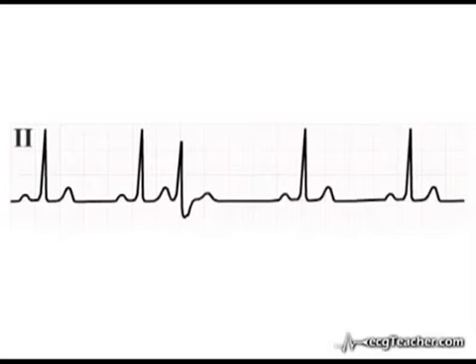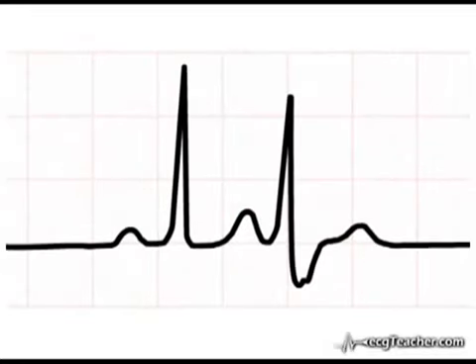However, as the initial events of ventricular depolarization occur as normal, the initial portion of the QRS complex of an aberrantly conducted premature junctional or premature atrial contraction will often be identical to the initial period of the preceding normal complexes. If the block is close to the AV node, this initial period can be very short.